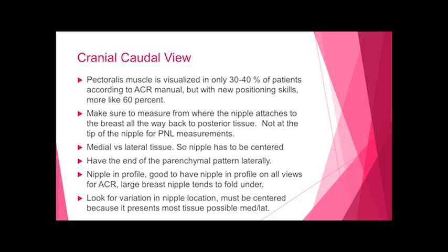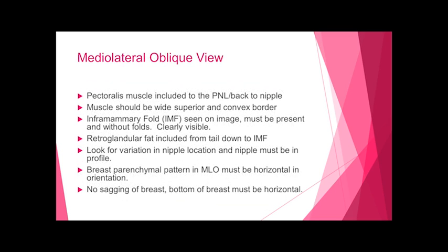Nipple must be in profile for your ACR in both views. It's good to have the nipple in profile on all the views when you turn them in. ACR does recommend it in one view only for your everyday standard, but when you turn in for ACR, they really like all the nipples to be in profile, because we know in the large breast the nipple tends to fold underneath. Now you look for variation in nipple location, but it must be centered because it presents the most tissue possible medial and lateral.